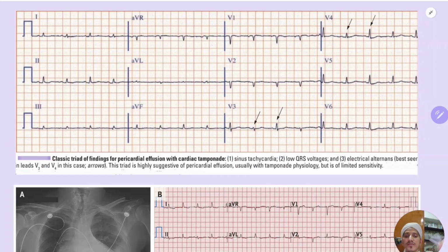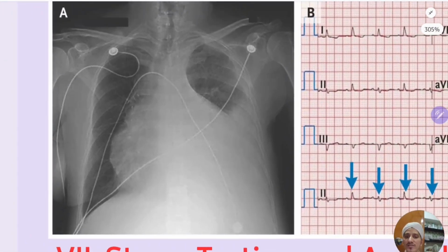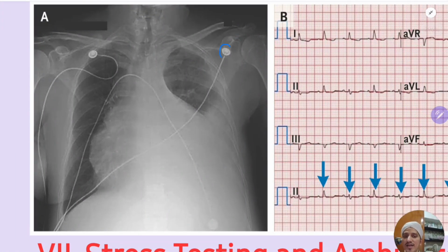Okay, the same thing is explained in this case. You are seeing here a patient with an X-ray, and you can see the electrodes. That means the patient is lying on the bed, and the shadow of the heart is very large. Okay, and you can see the scapula also, the border of the scapula. So which view is this? Whether this is PA or AP? So this is an AP chest X-ray.